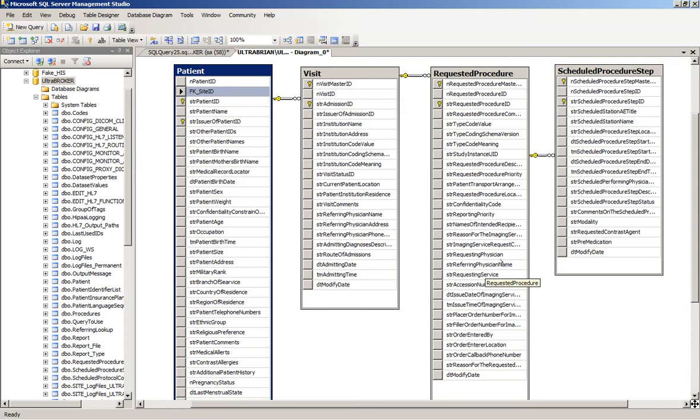You can see there's a second field, a second key in patient, which is the issuer of the patient ID. So every patient has an issuer. That issuer is usually automatically populated from the MSH segment. So in most messages, the MSH segment will tell you where that message came from, and that identifier as to where the message came from is the issuer of the patient ID.